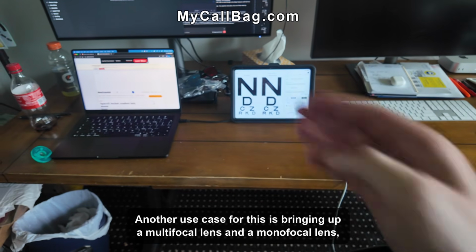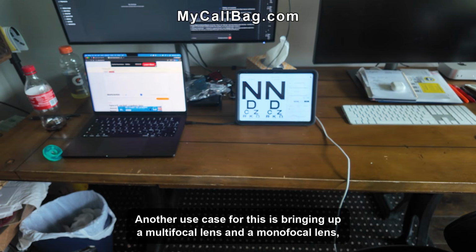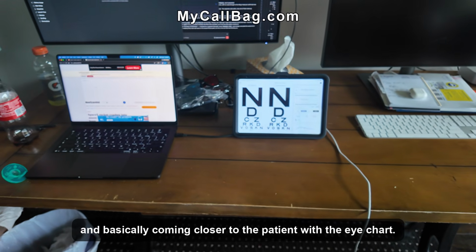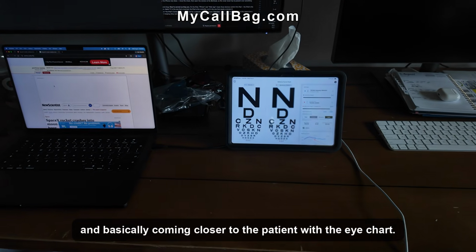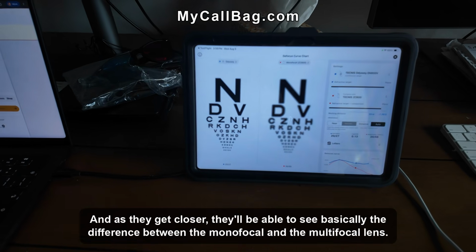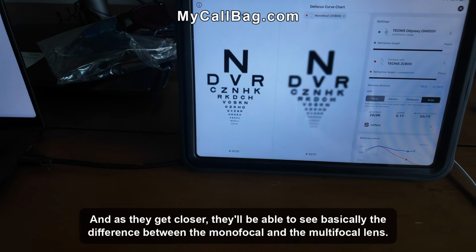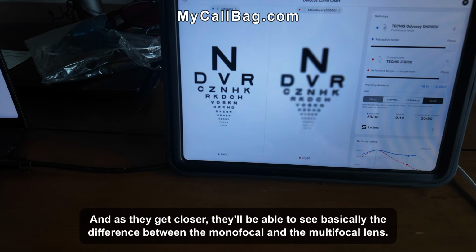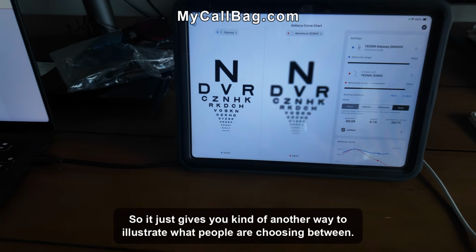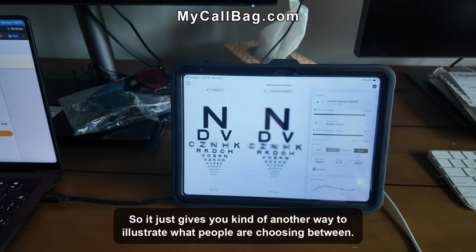Another use case for this is bringing up a multifocal lens and a monofocal lens, and basically coming closer to the patient with the eye chart. And as they get closer, they'll be able to see basically the difference between the monofocal and the multifocal lens. So it just gives you another way to illustrate what people are choosing between.